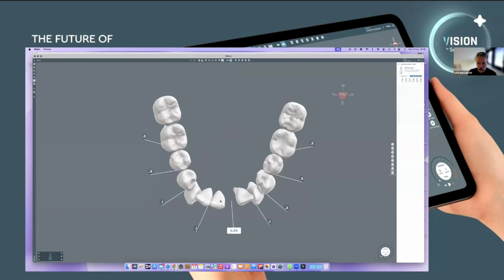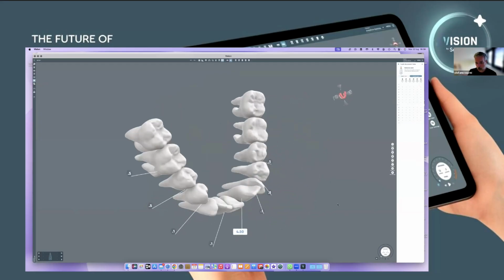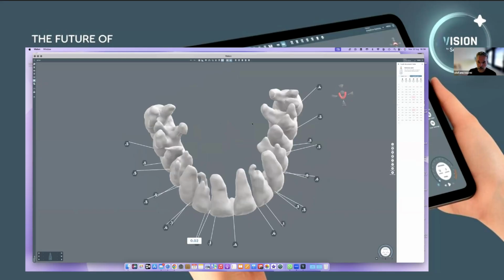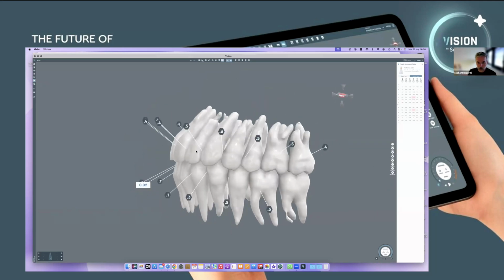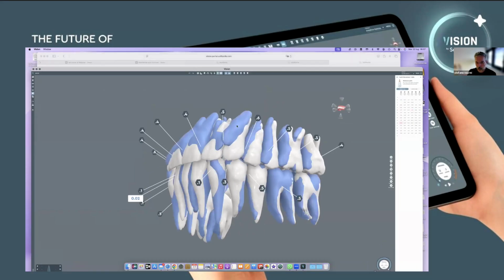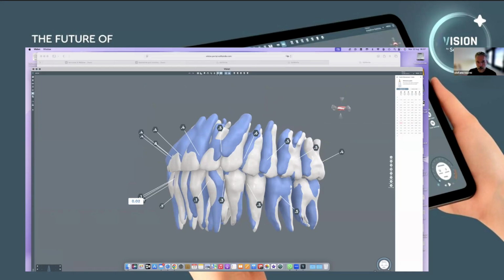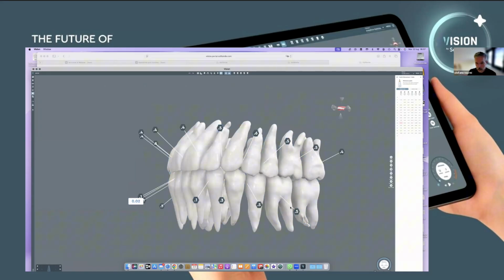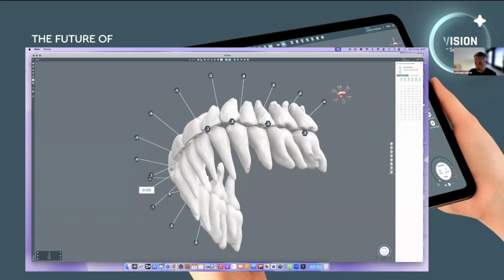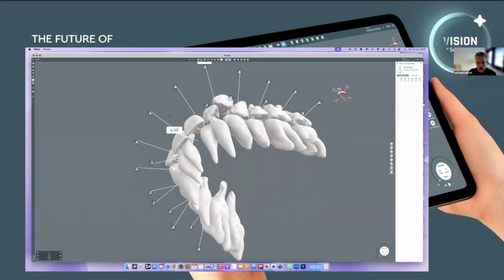And the doctor told me, I want to take off this one, and they want to put 2 mini implants here and work with mini implants to adjust the rotation. And also I want to adjust the position of this one because this one is here. You need first to create space for this one. Basically, move this one first.